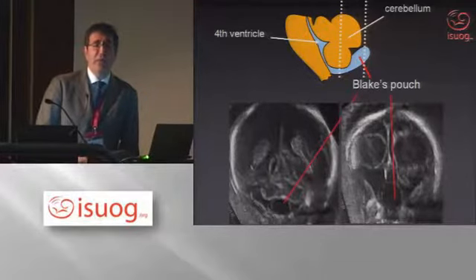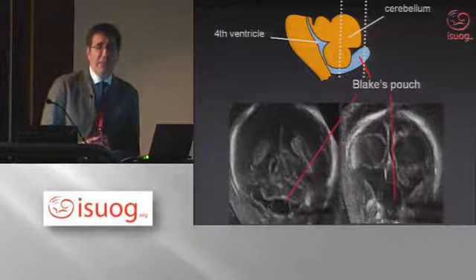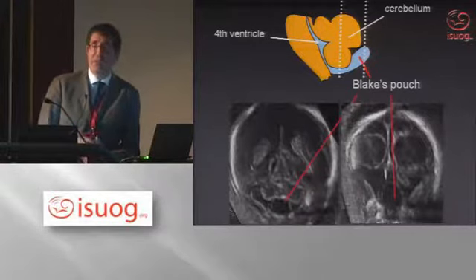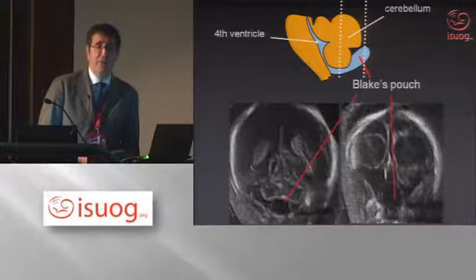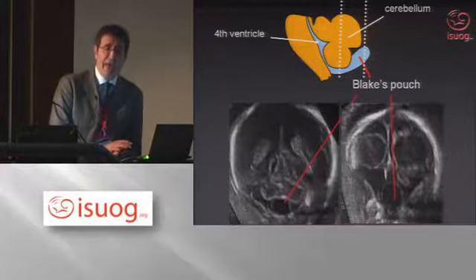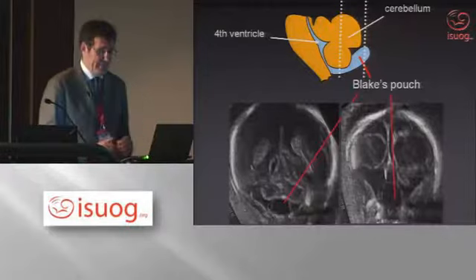It is almost never seen with any other diagnostic imaging tool, because ultrasound at mid-gestation with high-resolution probe has an exceedingly high level of resolution, in the level of about less than 1 millimeter. So if you happen to see a small cystic structure within an otherwise normal cisterna magna, of normal size, that is not a suspicion of abnormality. It is a completely normal finding. It is important for you to memorize this because we will go back to the Blake's pouch while we discuss the different abnormalities that can occur into this area.